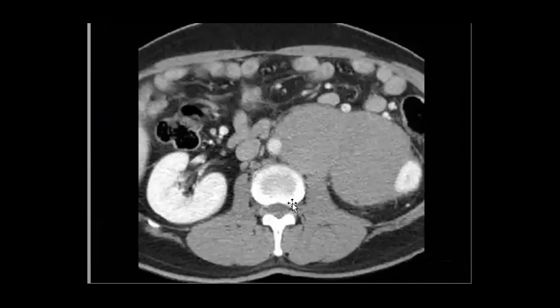Now, after you see the retroperitoneal lymphadenopathy, sure that you will put in the differential diagnosis the most important one, which will be lymphoma. Yes, but here, even on the CT, when you find this appearance, what are you going to check?